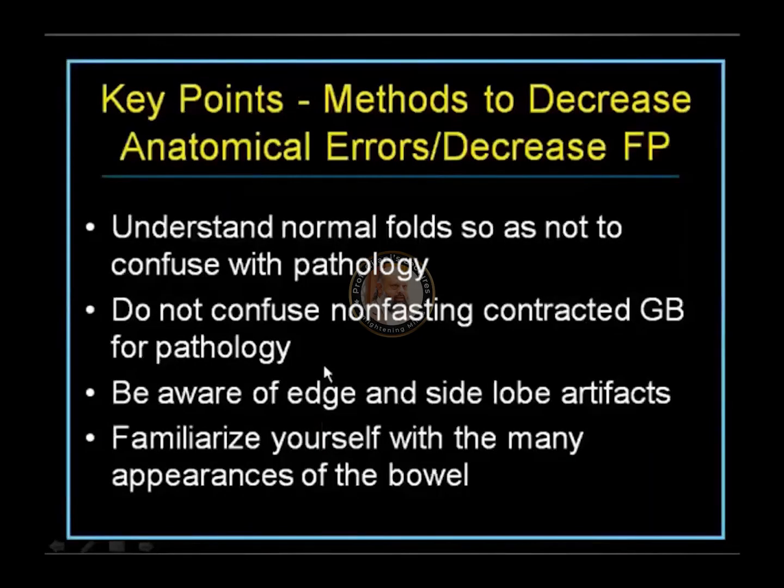The key points at the end are: understand normal folds so as not to confuse them with pathology. Do not confuse a non-fasting contracted gallbladder for pathologies, and be aware of edge and side lobe artifacts. Familiarize yourself with the many appearances of the bowel.